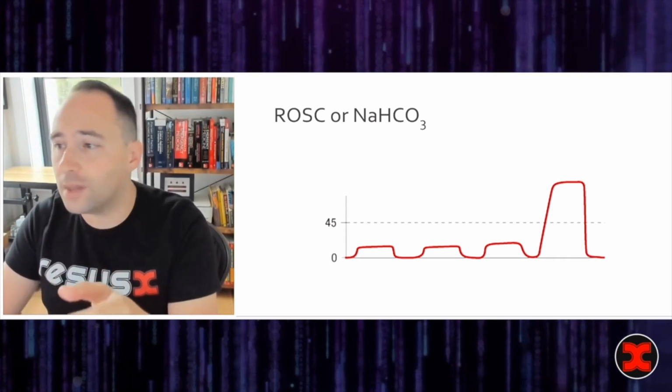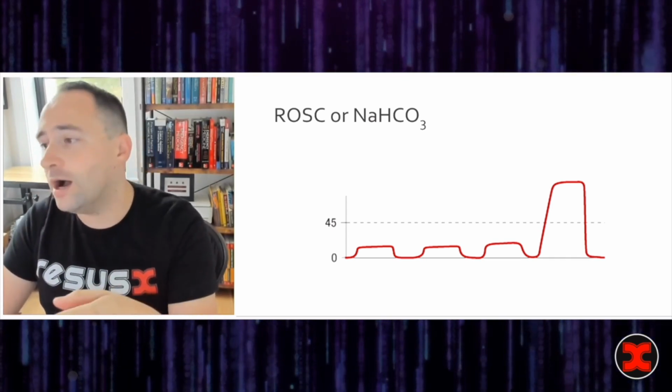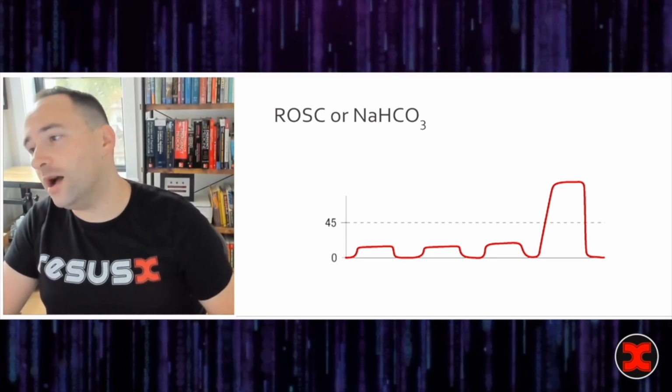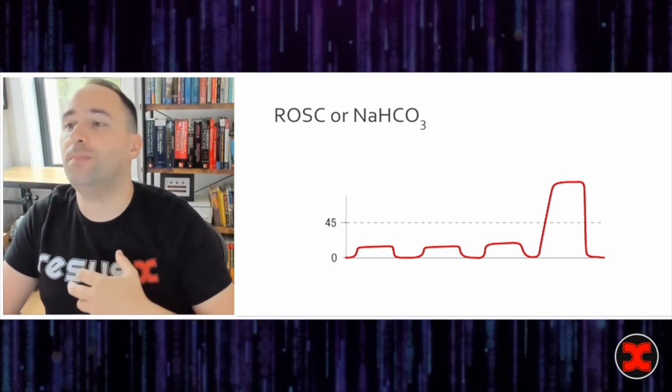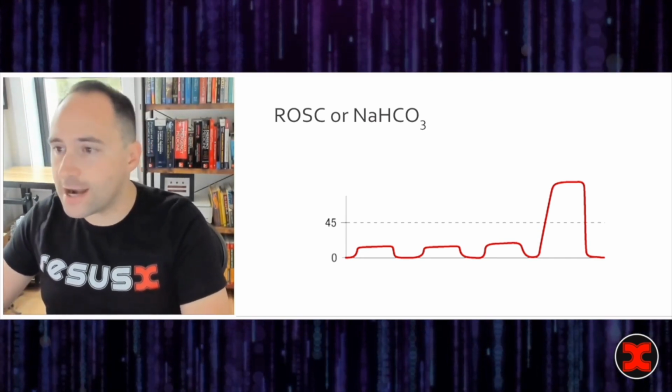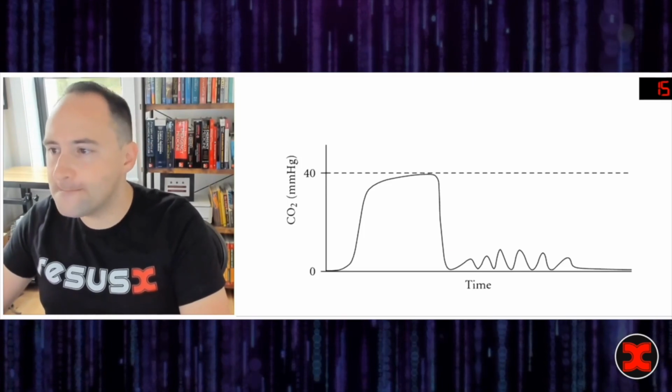Sodium bicarbonate is metabolized to carbon dioxide and water. And what you can see is when a patient receives sodium bicarbonate, the end-tidal will rise as the patient exhales the CO2 that was produced. All right, ready for the next tracing.